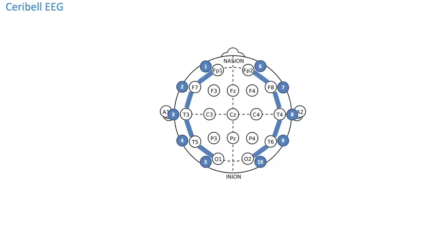As you see, this is not the 16-plus type of channels of EEG, for a given reason. It was designed as such. It wasn't because we couldn't put more electrodes. Putting more electrodes is not a big deal.